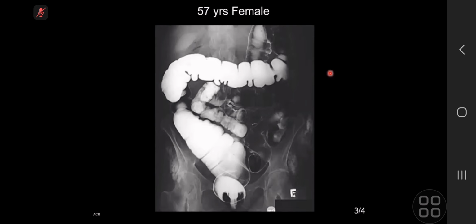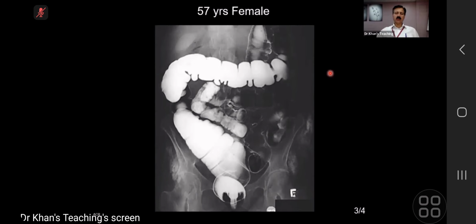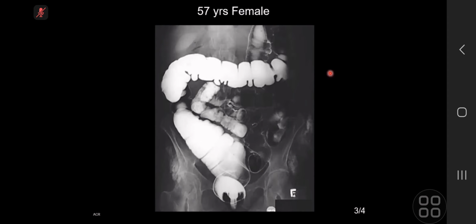So I'm describing this barium film or the previous ones? So previous ones, you remember that there was soft tissue calcification around the knee. Okay, soft tissue calcification around the digit, and with that, this is your third film. So this is one of the spot films of barium enema. In this one, on background, I can also see further soft tissue calcifications bilaterally in the pelvis region, laterally around the iliac crests. So that further shows more soft tissue calcifications. On the barium, I can see some changes within the fold pattern.